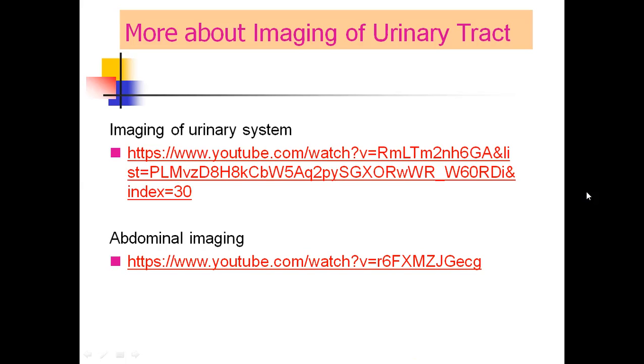These are films about diagnostic procedures in urinary system problems, and also look through abdominal imaging, because if we perform CT or MRI of the abdominal cavity, of course, we cannot evaluate only the status of kidneys and ureters, and close our eyes to problems of spleen, liver, gastrointestinal tract, and other organs of the abdominal cavity.